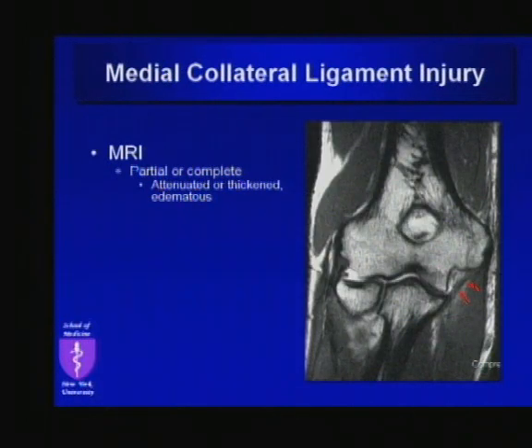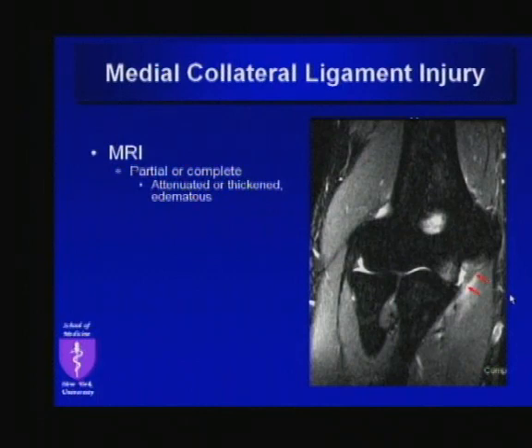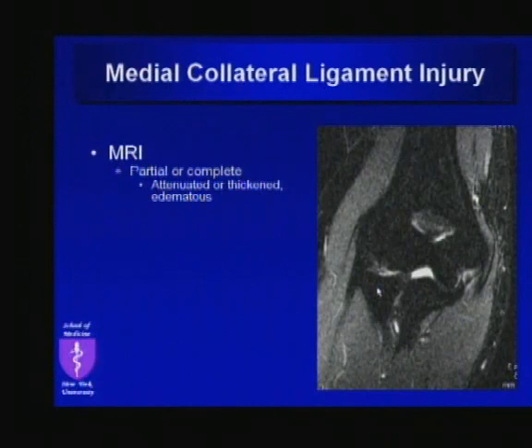This patient presented with more acute symptoms. Again, look at the nice dark signal in the radial collateral ligament on the lateral side. You can see signal isointense to muscle in the medial collateral ligament. That's not normal. When you look at the fluid sensitive sequence here, you can see high signal intensity in the MCL, surrounding edema and bony changes in the medial compartment. This was probably more of an acute injury, i.e. some sort of sprain.